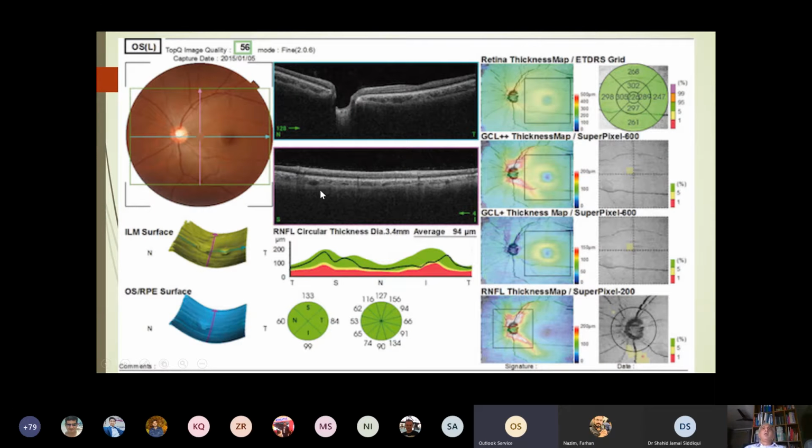Here you can see a scan showing retinal macular thickness, because nowadays, as we already pointed out, there are three things. One is the retinal nerve fiber, the second is the optic disc cup parameters, and the third is the ganglion cell analysis which we do. So it is important to see the ganglion cell. This is a composite map on the Topcon in which you can see the retinal fundus photograph and the disc both together.